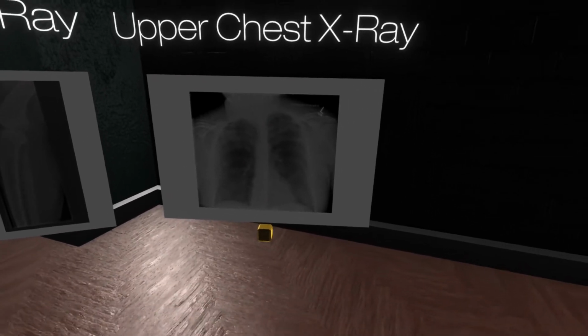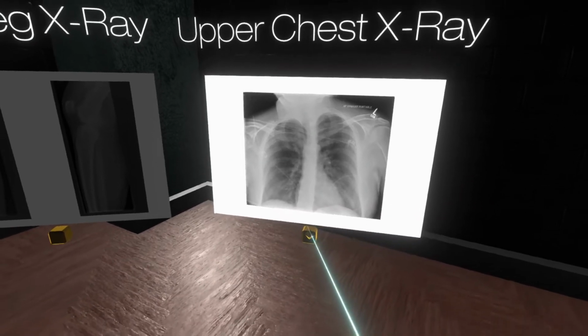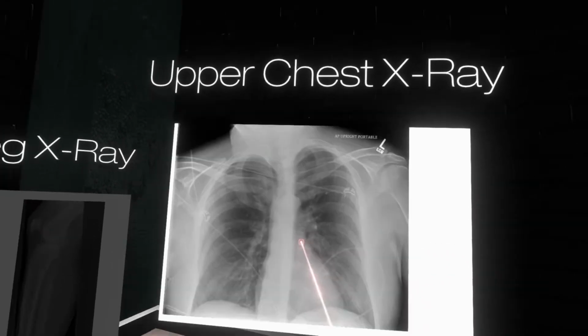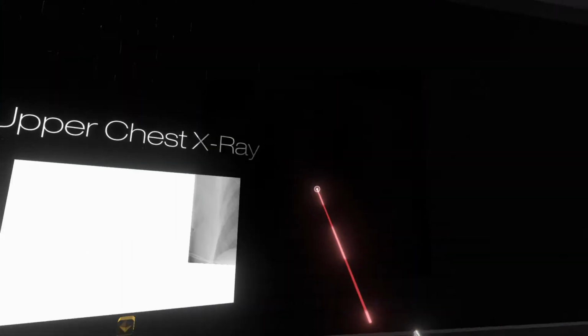So we have an upper chest X-ray here, and we have a simulated light box here that I can turn on by hitting this checkbox here in VR. And I can also move this around. And I can also take the X-ray off of the light box and hold it up to the sky and take a look at it that way.